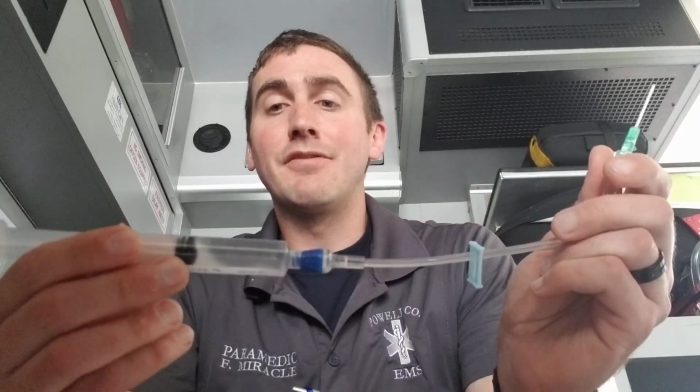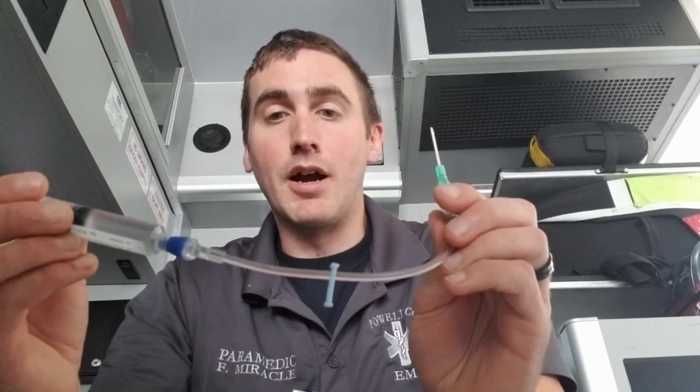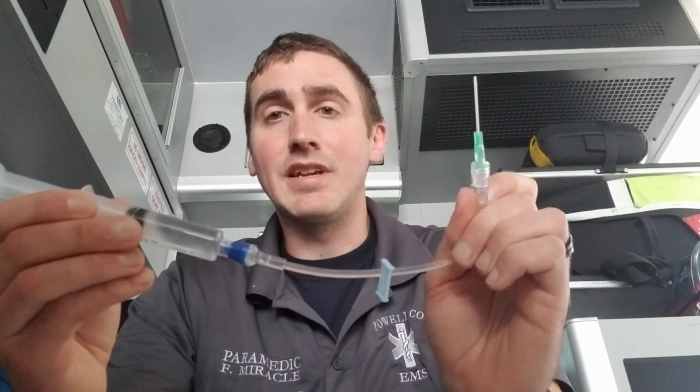You saw here that I have to give 1.5 mLs of saline before it gets to the tip of this catheter, or to the patient. That means that with my concentration of nitro at 200 mics per mL, I would have to wait about 15 minutes before any of that medication got to the patient if I did not prime this extension set and IV catheter. So now that we know how much fluid we have to push through this, or medication we have to push through this before it gets to the patient, we can prime our extension set and IV catheter before putting it on the pump.